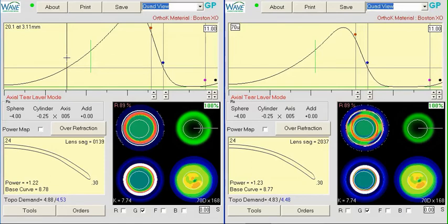So we've added a little bit, and I don't find this to be a one-to-one, meaning we're going to get 0.2 millimeters greater in diameter of a treatment zone. But I feel like it's just not a huge difference, and we do have a lot less lens out here now to maintain centration on the cornea. But I think this will give you a slightly larger treatment zone, and it may even be enough to get rid of the patient's symptoms.